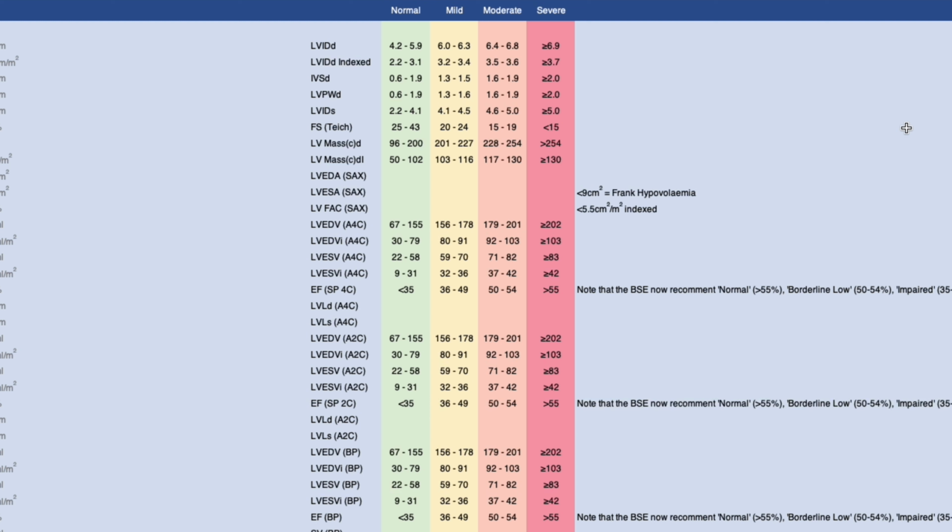Each tab will have one or several summary boxes where you can write the conclusion for that specific structure. One slight nuance with Excel that you need to remember is that if you want to write on a new line, you need to press Alt or Option and Enter, rather than just pressing Enter. Otherwise, it will complete the entry for that tab.